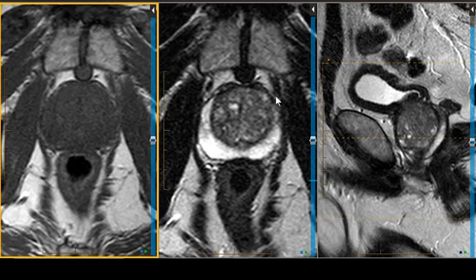in concert to show us the status of the anatomic capsule. So we're looking for something big and gray and dark abutting this capsule. The bigger it is, the more likely the capsule is to be invaded. So when you start to get over 1.5 abutment of the capsule, the incidence of capsular crossing goes up. Over 2 starts to dramatically go up. Now when you look at the capsule on the T1, you're looking at the fat. The fat can be a little bit asymmetric. If you think you've got fatty invasion but you see nothing on the T2, you're wrong.